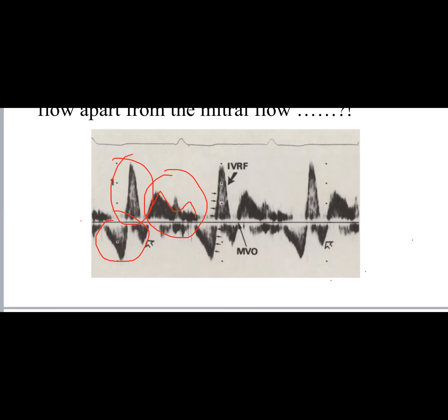It's so unusual to have this flow between the aortic flow signal, systolic signal, and the mitral diastolic signal. Usually this period is occupied by the isovolumic relaxation time during which there is no flow, right? It's just a time, an inert flow. Now I have robust flow during this time. What does that mean? That means severe HOCM.